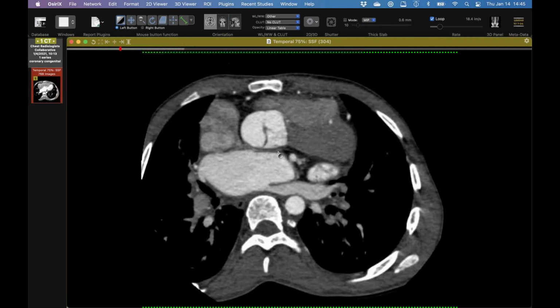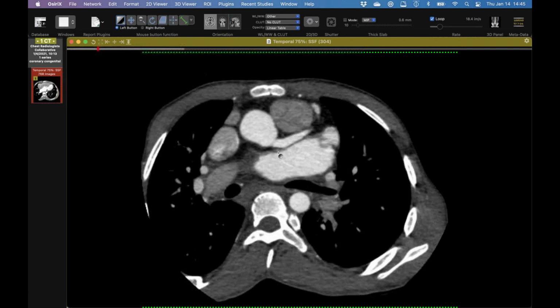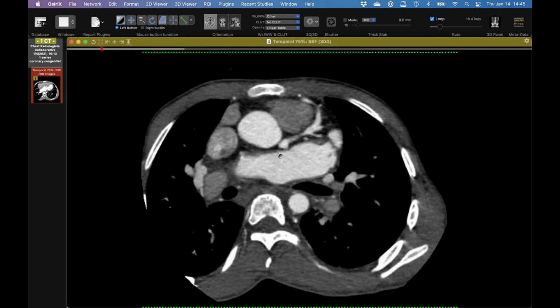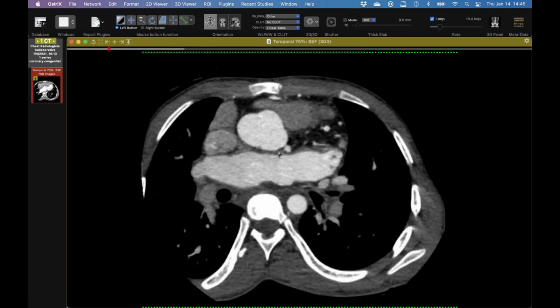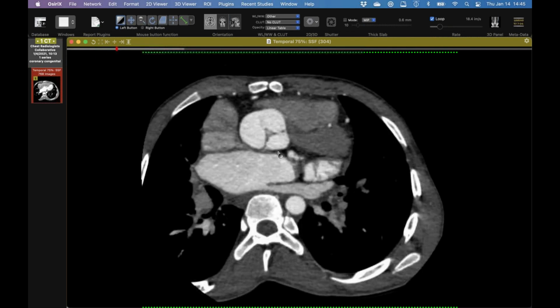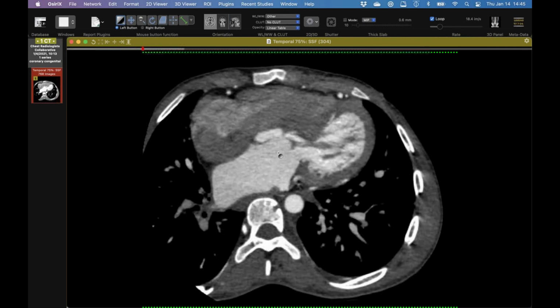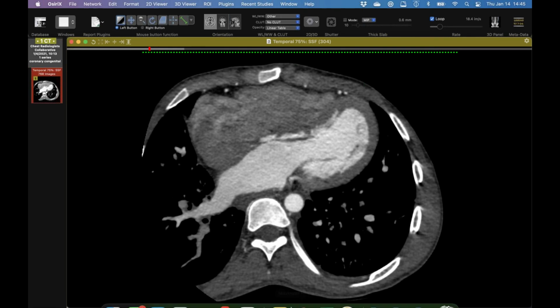Yeah, very nice. Yeah, no, single lefts are rare and prepulmonic lefts are rare. Is there anything retroaortic? The only time I've ever seen retroaortic RCA, there's a right that might be an SA nodal branch. Yeah, I think you're right. That's exactly what it is. It's coming off the circ right here and slides in there. Yeah, and I've seen that a lot of times.